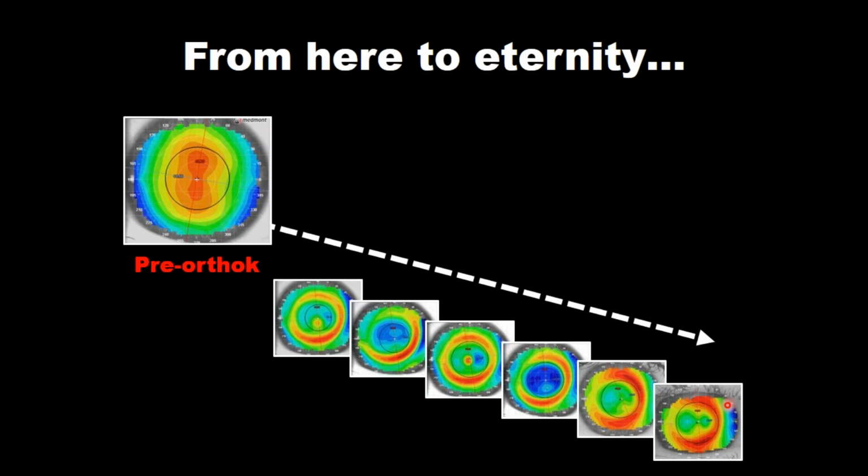The second thing you might consider is there is always going to be another post-treatment visit. For as long as you see that patient in CRT lenses, you will always be able to map them again, but you will never be able to have a baseline topography unless you normalize the cornea, and that could take months. So the baseline topography is the most important. It determines your initial lens success, and then it's used to compare the baseline cornea to every visit moving forward till the end of time in CRT lenses. So spend the time on the pre-ortho-k map.